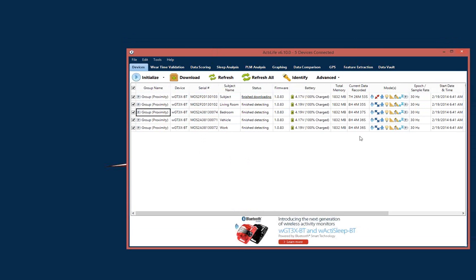You'll notice that in the mode area, I have a section that shows me which icons indicate which modes are enabled for this device. You can see for this particular device, the proximity tagging is enabled, and that's the tag on the end. And then the mode, whether it's a receiver or a beacon, is indicated by the blue or red icon. So that's just a quick reference.